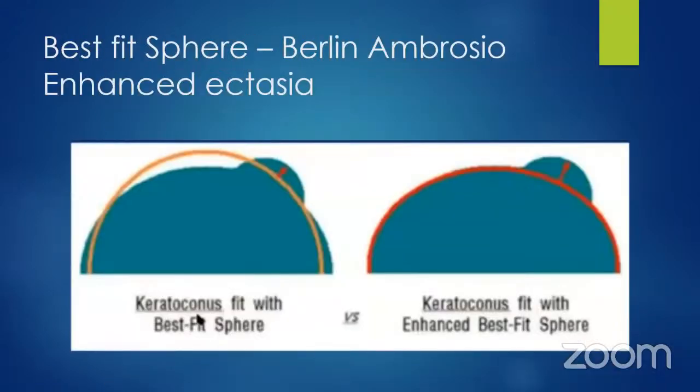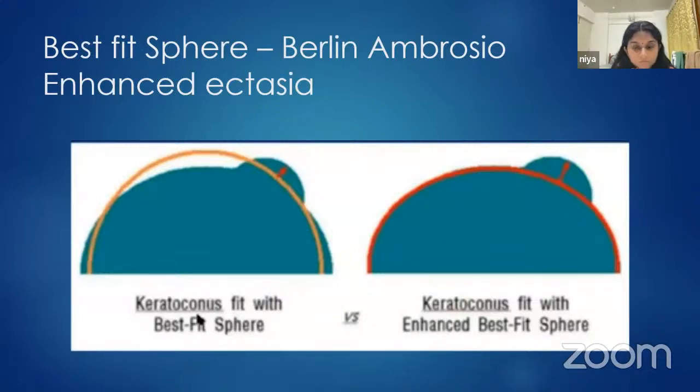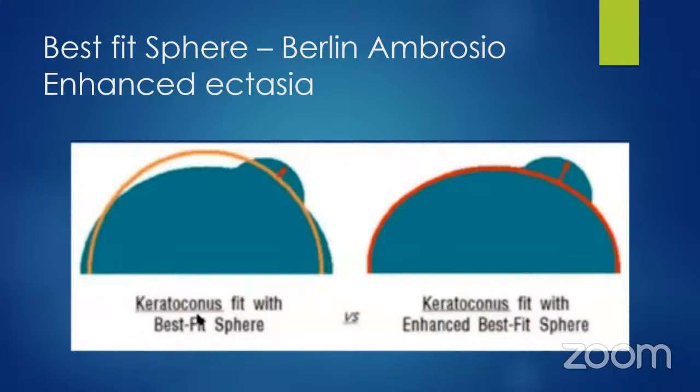Did you understand this part? This screen that I'm showing you right now? Yes, ma'am. So what is happening when we say best fit sphere?